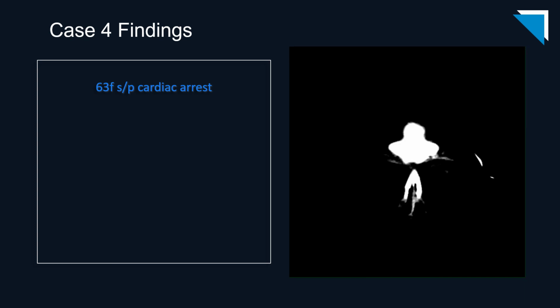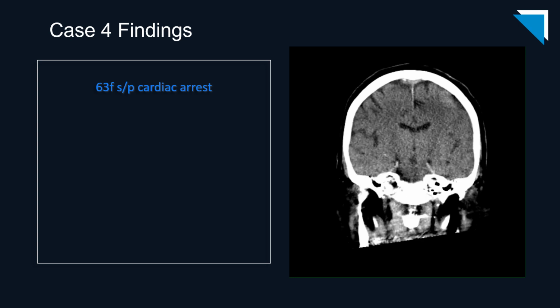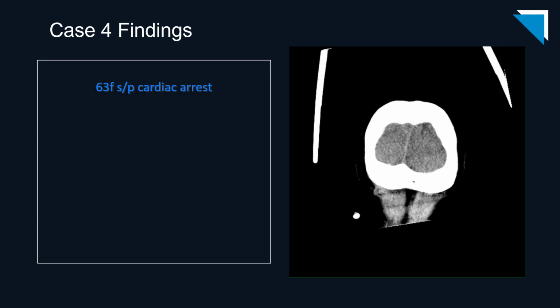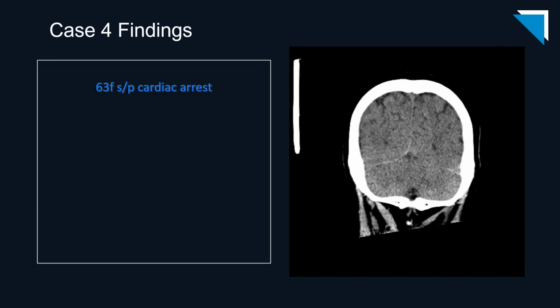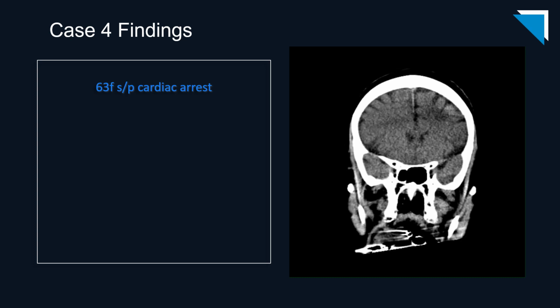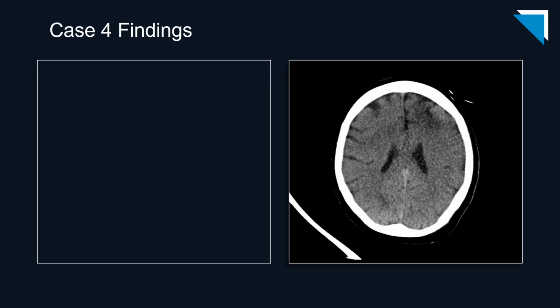On to the coronal images from the same patient. You could certainly argue that the findings are more subtle in this case, and if you didn't have the clinical history of cardiac arrest, you might be less inclined to call this outright, but a quick call to the referring clinician would clear all that up.